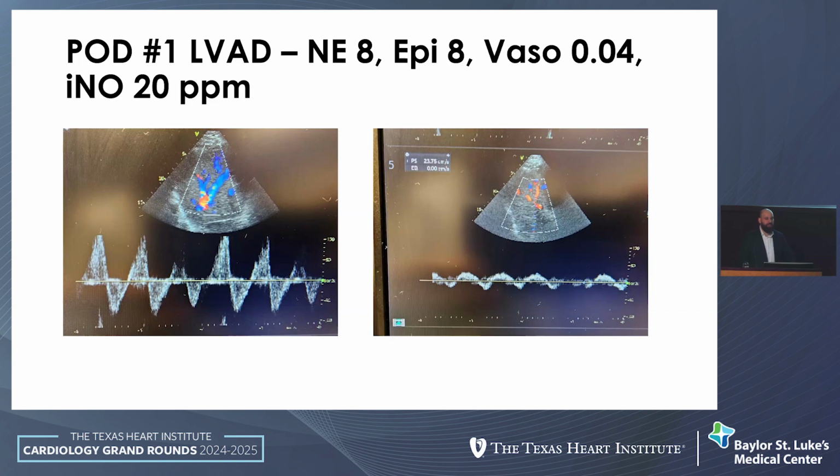So you can clearly see on the left the hepatic veins show what? They show systolic flow reversal. We know that the right side's not doing well. But if you look at the right here, this is the portal vein. What do you guys see here? Pulsatility. Pulsatility is bad. It's not only pulsatile, it's crossing the midline. It's biphasic. So there's actually retrograde flow.